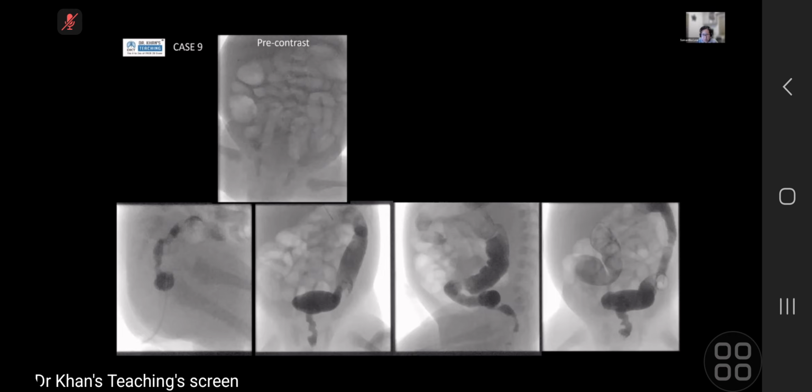Right lower abdomen. Are you talking about these? Are these just bowel loops that I'm looking at? For me, that looks like your sigmoid, your descending, your transverse, and that's your ascending colon. So that's probably your cecum, and those are small bowel loops interposed over each other. That could be cecum because it's the same region. Okay.